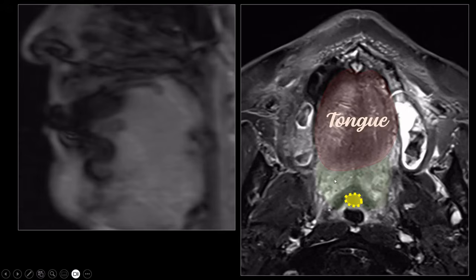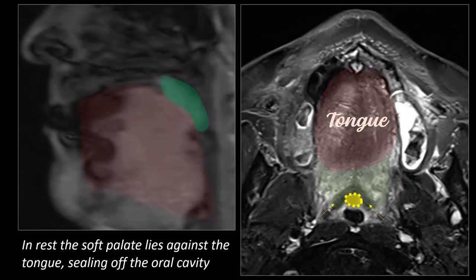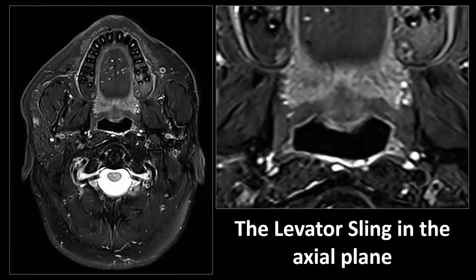And you will see, and this can be a bit confusing on actual images on CT and MRI, the soft palate in rest immediately lies against the back of the tongue. So we don't see air between those. So we have these soft tissue structures lying next to each other, or on top of each other. We have the tongue here, and then the soft palate lying immediately on top of it, sealing off the oral cavity, which can make actual images sometimes a bit more difficult because you don't really understand what you're looking at.